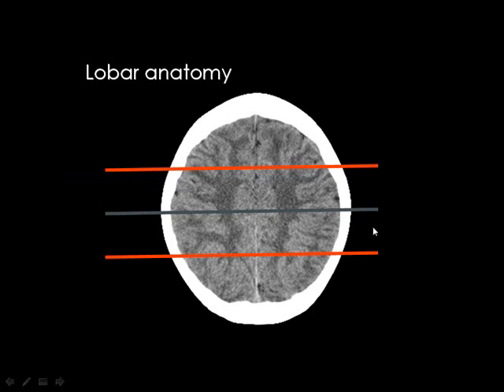The first one will belong to the frontal lobe, and there is no more occipital lobe. The occipital lobe is very small, and it cannot reach this high level. And also the temporal lobe has finished inferiorly, and you are left with the parietal lobe. Then you have only 1/4 for the frontal lobe, and the rest of the section will belong to the parietal lobe.